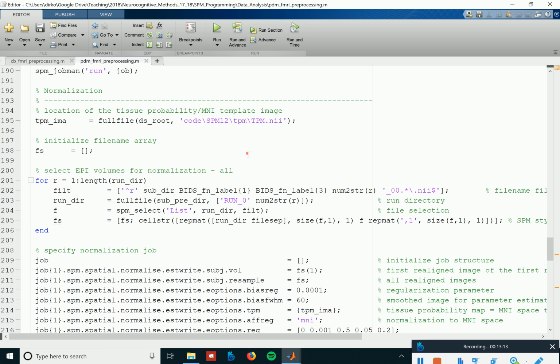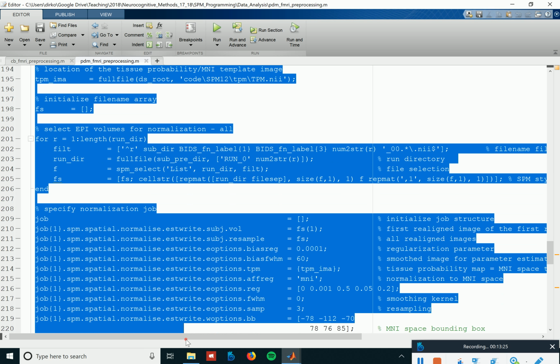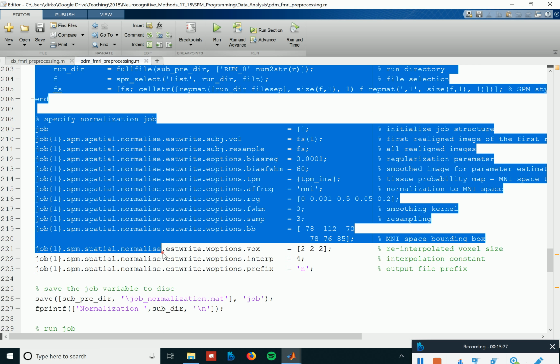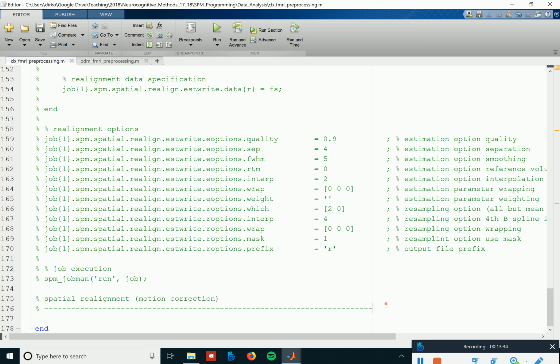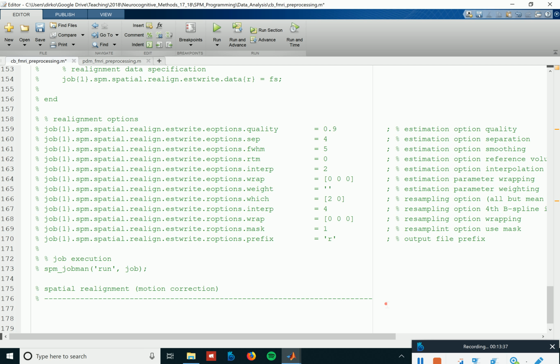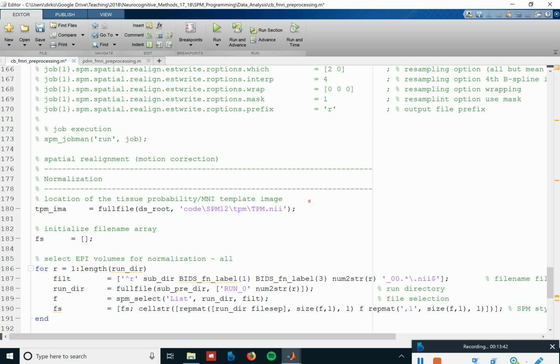We could of course again go through the GUI and create this and then copy it, but somebody already did that for us. So let's see whether we can reuse this, and also see whether we can improve what we have done. Now I'm copying this kind of code from somewhere else, and let's see what it tells us.